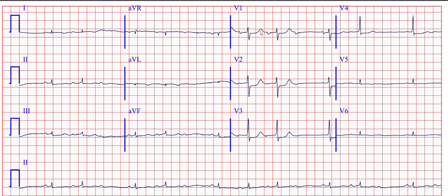What else can you think of that favors posterior wall infarction apart from these two things that I told you? Can you guess? Here you can see this R wave is a little taller in V1, V2. Given this is low voltage, this whole ECG you can see there is low voltage, right? You can see how low the voltage is here. And even this much bigger R wave is greater, or you can say it is high amplitude for V1, V2. So the R wave is greater here in V1, V2, which is not typical.